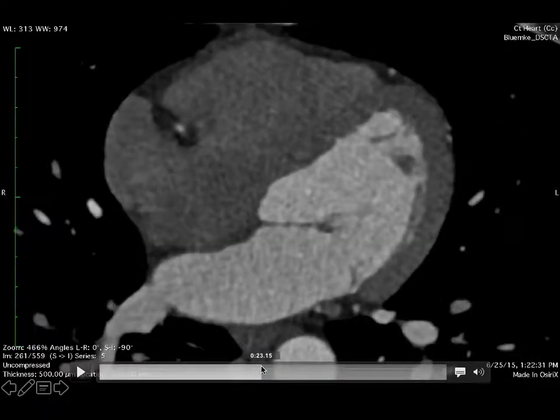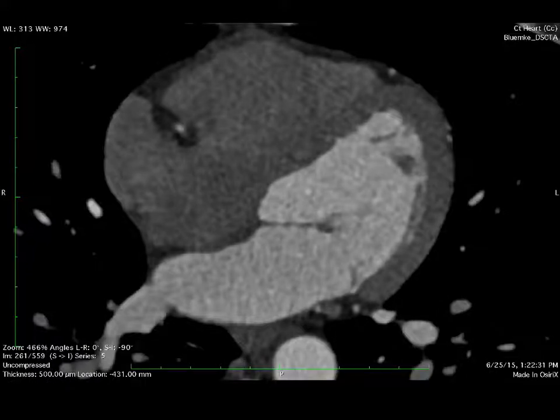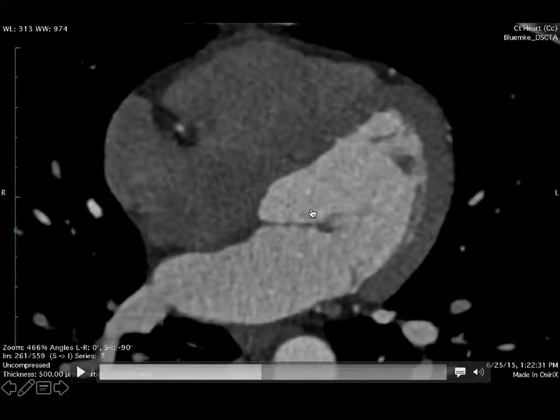Again, the basic premise is that you have contrast agent in the blood pool, which is causing a greater attenuation of X-rays, and therefore the blood will show up brighter on CT, since the Hounsfield unit is linearly proportional to the linear attenuation coefficient. So we have myocardium, air, well, lung tissue here, which is mostly air, blood in the left ventricle, blood in the right ventricle.